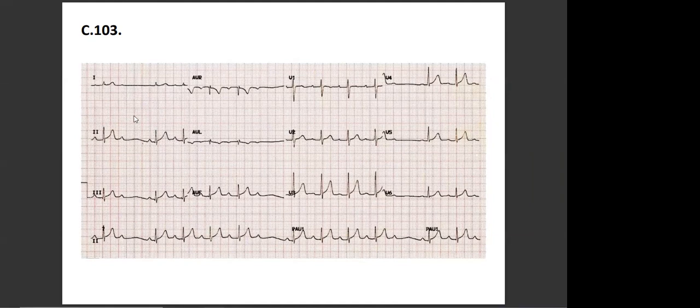Well, I don't think that is 60 degrees, because lead 1 is the smallest one, so it's getting closer to 90. But lead 1 is positive and AVF is positive, so it's normal. And if you compare 2 and 3, they look almost the same, except 2 is a little bit bigger. So I would say 80. This is because lead 1 is almost equiphasic. Oh, okay, thank you. Okay, good. So close to 80, like you said.